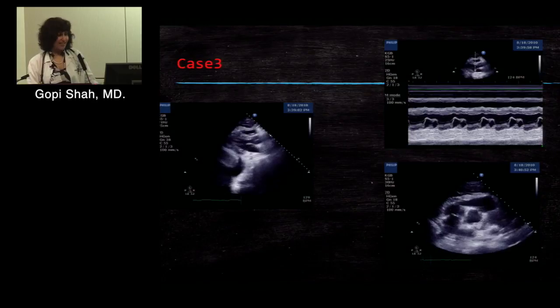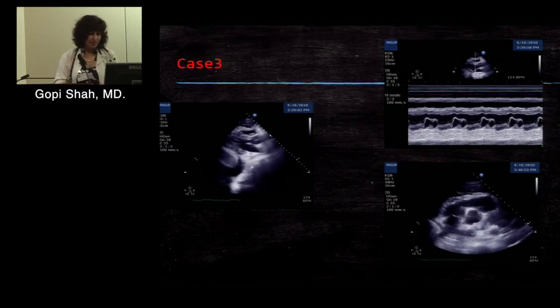So this is what a potential mass or a blood clot would look like, right? It's not going to be very echolucent. You're going to have an echogenicity to it. But what is very striking is that, if I had to describe it in layman's terms, the RV is struggling to stand up. The RV just seems not to be able to get its head up, butting its head on a ceiling kind of deal. And you see that beautifully here too.